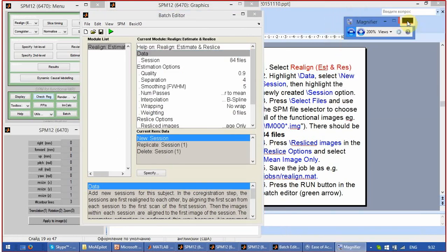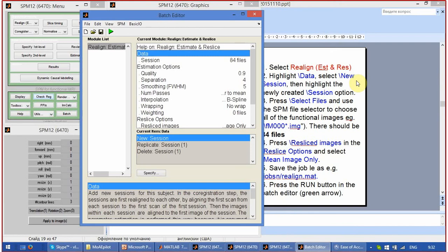So if you want to repeat your analysis, it is very easy. And if you want to figure out what exactly has been done during different steps of the processing and analysis, you just go to the folder where you store all your jobs, and you see and read, and you can always repeat the analysis or repeat it with some modifications if you need. It is extremely useful to save every step, and you can do it.